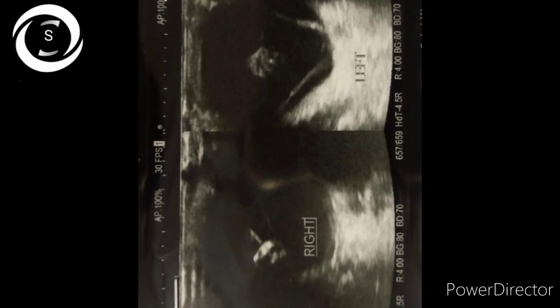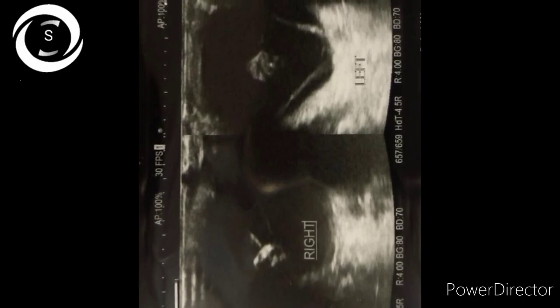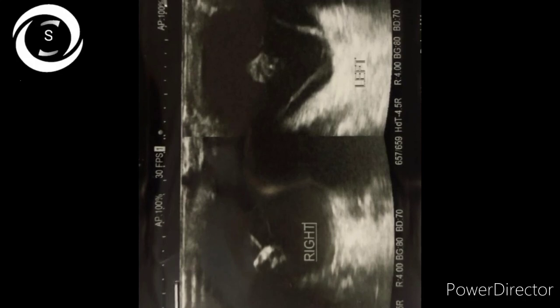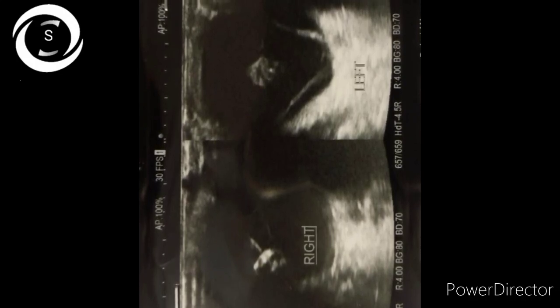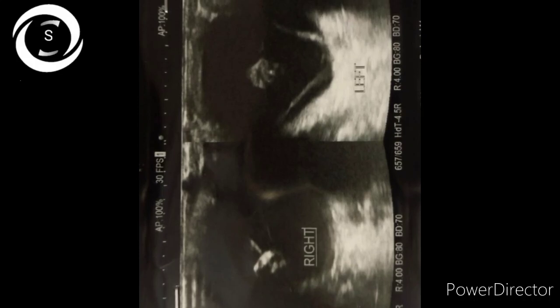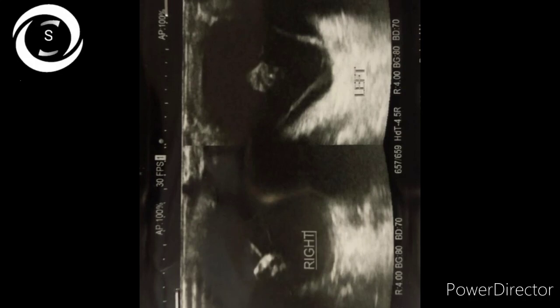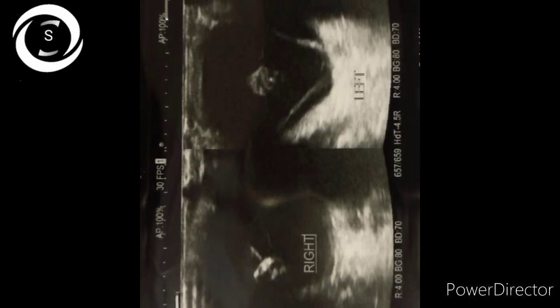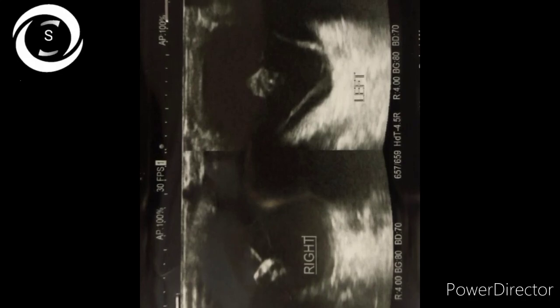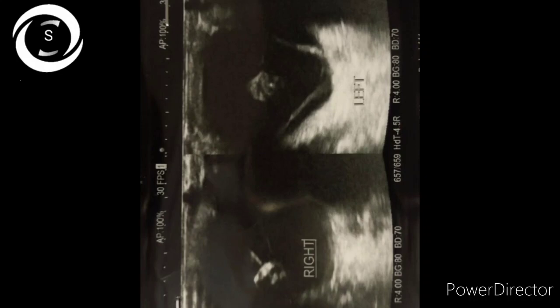Why is it done? Well, it is done in opaque media like corneal opacity, corneal scarring, hyphema, blood in the anterior chamber, dense cataract, when you are unable to see the posterior segment of the eye, and vitreous hemorrhage, to confirm the health of the posterior segment, vitreous and retina. Then I asked the third question: why has it been done in this patient?